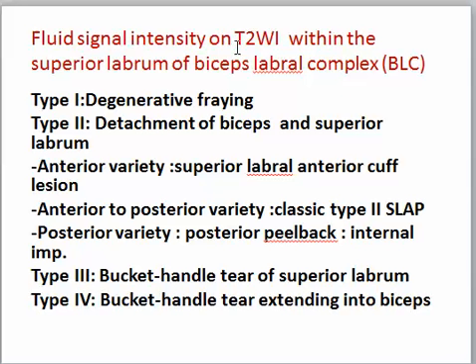Fluid signal intensity in T2 weighted image within the superior labrum of the biceps labral complex is either due to degeneration or detachment or superior labral anterior cuff lesion, or anterior to posterior, that means classic SLAP.